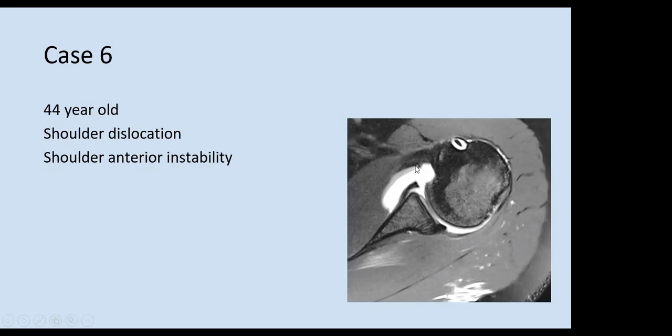Okay. So normally this is what we would say: this is MRI arthrography. This is not joint effusion. The way to tell whether this is joint effusion or MRI arthrography is, firstly, the history is instability. And remember, for instability, we always do MRI arthrography to assess the labrum. Secondly, you can see there is an injection site here because in our center we do the arthrogram from a posterior approach. So when you see an injection in the shoulder joint, it always indicates this is an MRI arthrography technique.